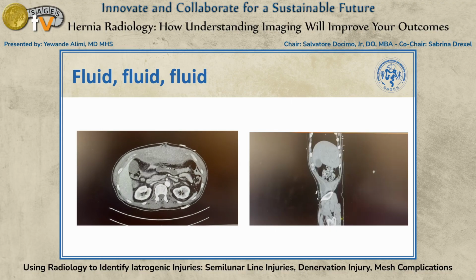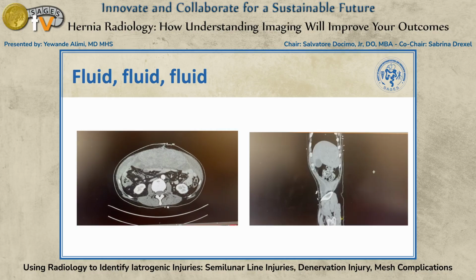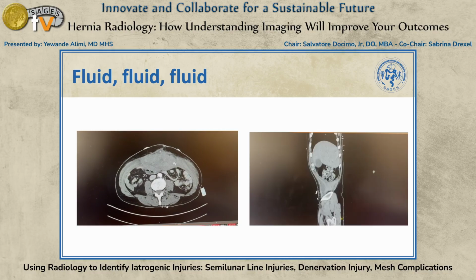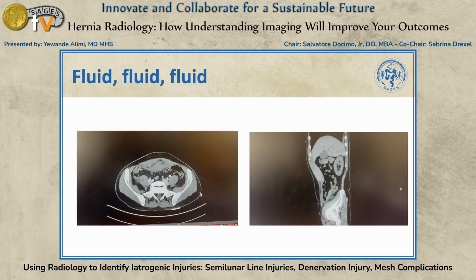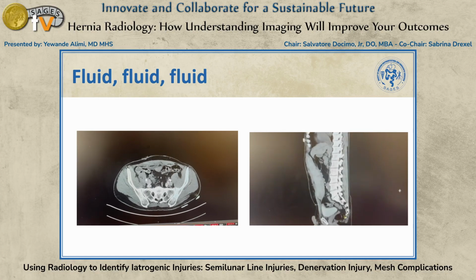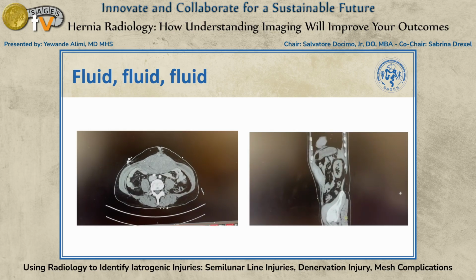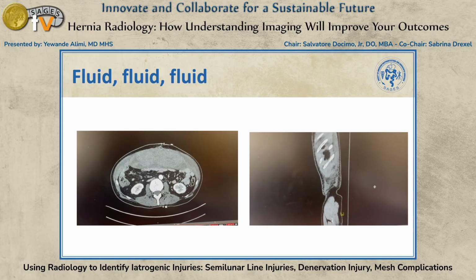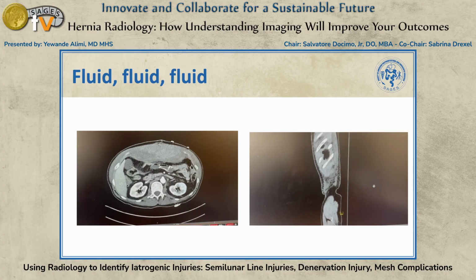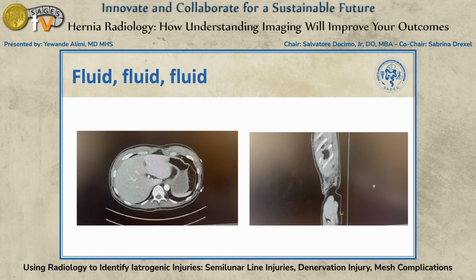And you see this large fluid collection that appears to not just be simple fluid, but likely blood. And ultimately, this patient had a rectus sheath hematoma that was managed conservatively with expectant management, pain control, and reassurance so as to not infect the space, infect the mesh. But ultimately, utilizing our CT scan here, we're able to see the apparent complication of a rectus sheath hematoma postoperatively.